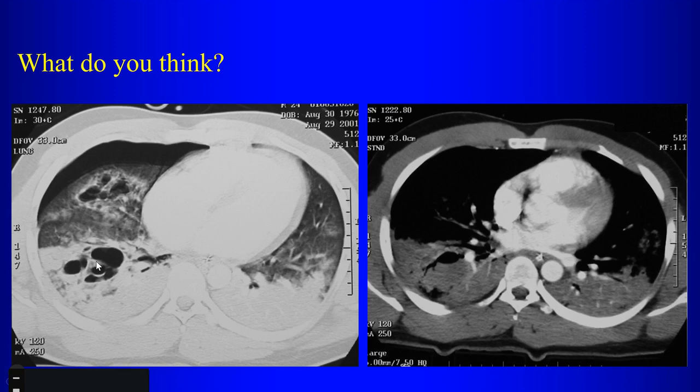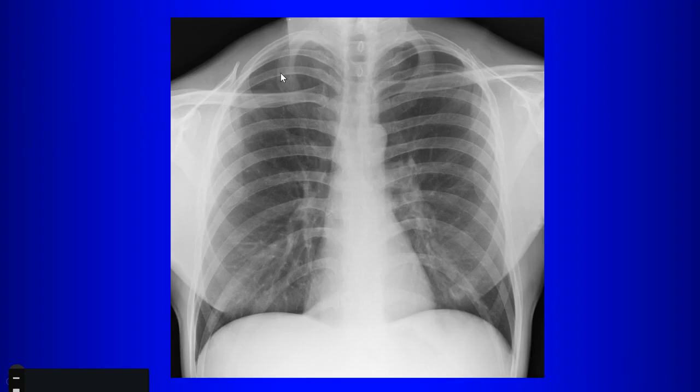So what are these? Those are lacerations, right? So in a trauma patient who has these irregular air collections within the lungs, those are pulmonary lacerations. Those are tears in the lung. They can fill with air and blood, right? So these can also go on to form pneumatoceles. So the consolidations then in this trauma patient represent pulmonary hemorrhage. This is bleeding within the lungs in a patient with trauma. So trauma is another cause of pneumatocele formation.